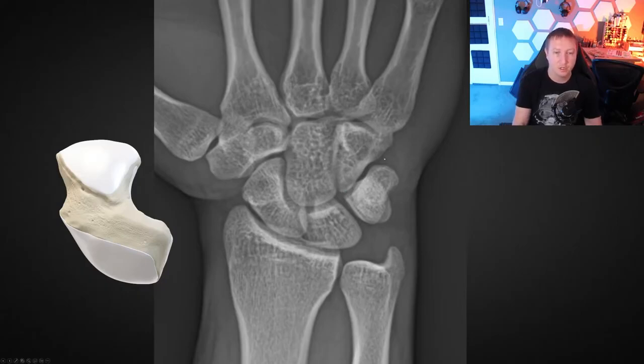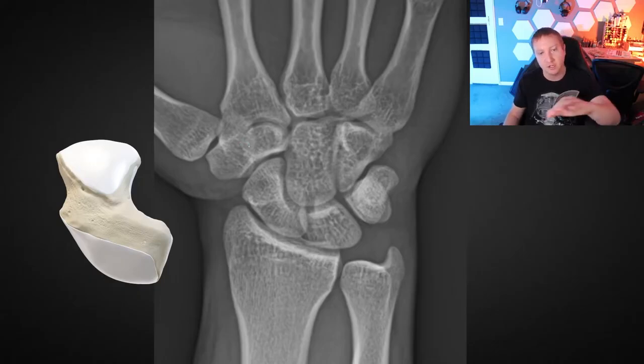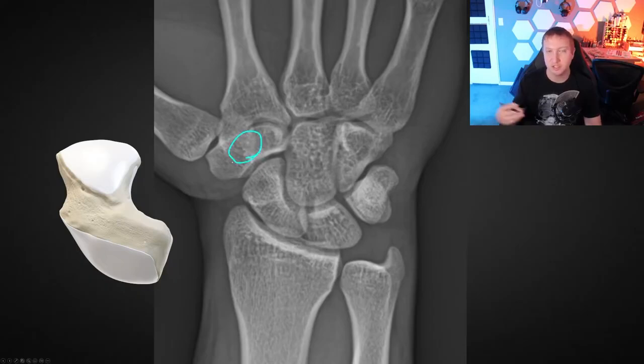All right. One other thing to point out is that because of the arc of the wrist, we often don't see all of these joint spaces that well, particularly the trapezoid and trapezium joint, because of that overlap and the contour of the bones here. So this is not coalesced or anything like that. That's just how it looks. Similarly, you can have a similar appearance with the hamate and the capitate because they do overlap a bit projectionally.